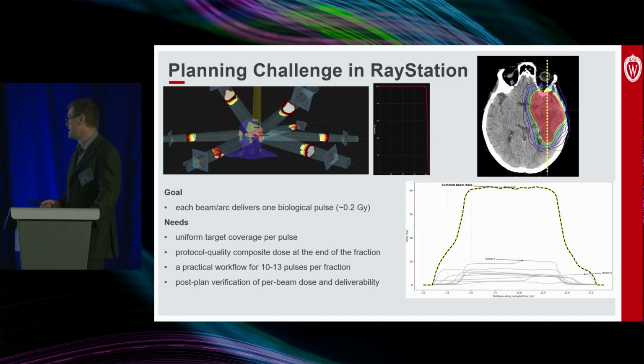And if we draw a line just through the isodose distribution and we look at the dose profile from that, it looks nice and flat. But of course, when we break it apart into all the separate beams, obviously the beauty of IMRT is that different beams contribute different amounts of dose to different parts of the target, and the whole sum is a nice uniform line dose, but in fact we have multiple different beams with very non-uniform deliveries. The goal with this technique is to deliver exactly the same dose in the 3 minutes to the entire target, and so that becomes kind of a bit of a trick. And there's a couple different solutions that we've got here for it.